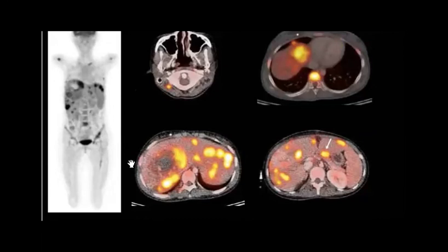But don't forget the teaching point here: the liver lesion, especially when the uptake is very high and some of these lesions are necrotic, maybe this is the primary. When you find a large lesion, it could be primary or secondary. I agree with you, if it is primary it would be hepatoblastoma. So we check the clinical data and previous imaging, including the alpha fetoprotein. If you find it very high, then you mention hepatoblastoma until proved otherwise, right?